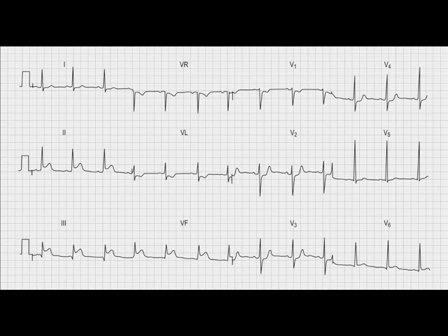In fact, when you have an inferior myocardial infarction, very commonly you see those early V leads, or C leads, demonstrating ST depression. Conversely, if you see ST elevation in the early V leads, you see ST depression in the inferior leads.